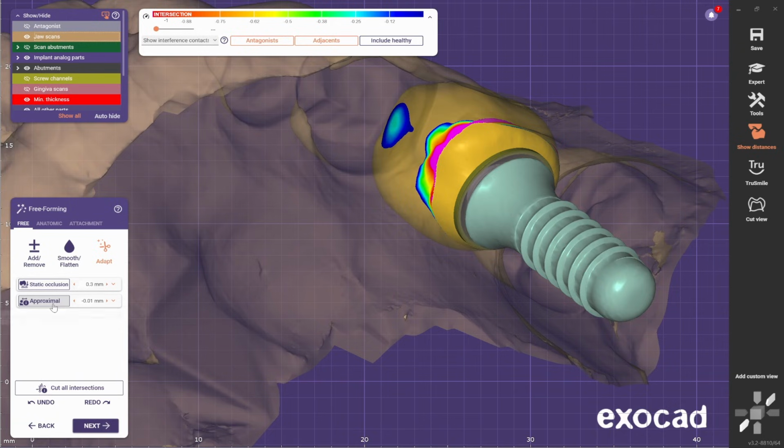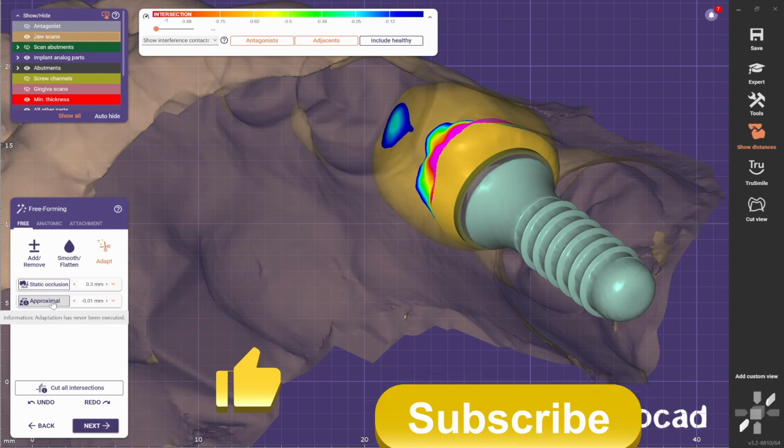You might use different ones, because you might find that, for example, with these settings, you still have an open gap, an open contact, or sometimes you have too strong of a contact. So I suggest for each and every milling machine, you have your own settings, so you are sure that if I select this, I'm going to have a contact in the end.